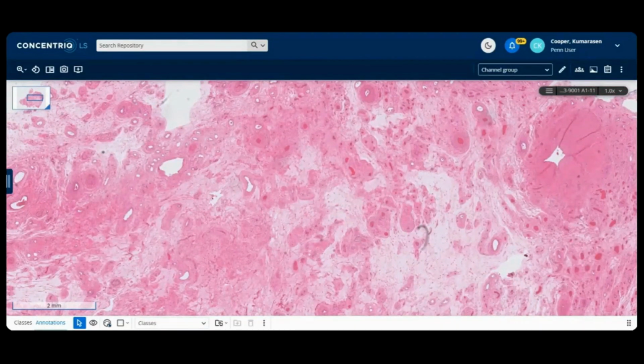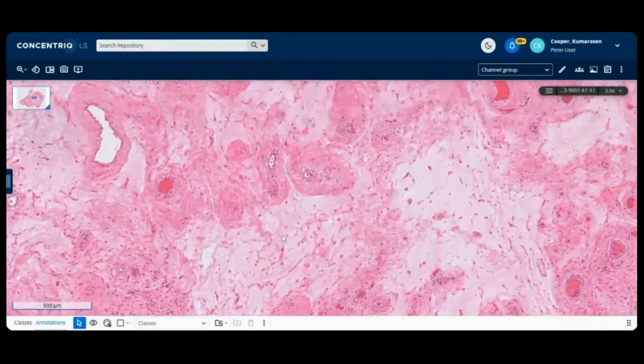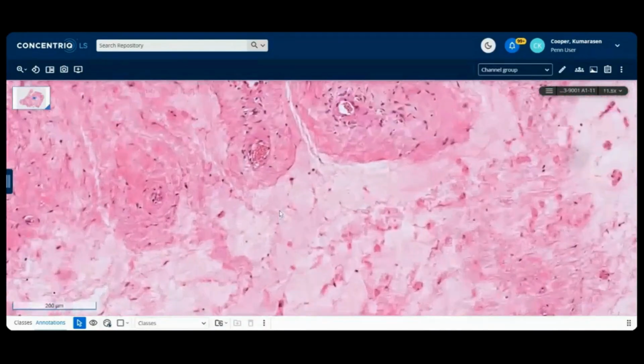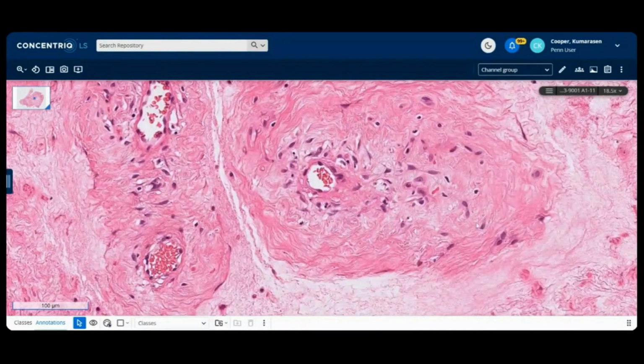But this is angiomyofibroblastoma. Now, why am I confident of that? Because these epithelioid and spindle cells around these blood vessels, these are desmin positive. That's a useful clue to that. Now, desmin's also positive in myofibroblastoma. So you have to keep that in mind as well, because myofibroblastoma comes into that differential, but myofibroblastoma does not have these thick wall vessels that you're seeing, and these large vessels, the variable size of vessels.